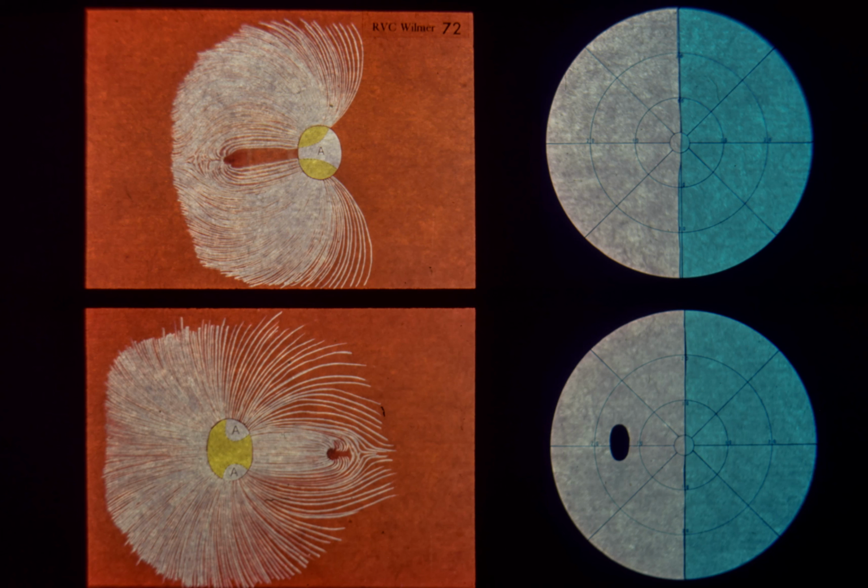Lower left. The artist's sketch shows the pattern of nerve fiber loss and optic atrophy in the left eye of a patient with a left optic tract or lateral geniculate lesion. Loss of temporal fibers results in diminution of reflexes from the superior and inferior arcuate temporal bundles and a more vertically oriented central disc pallor. Lower right, a patient with a left optic tract or geniculate lesion will have a nasal hemianopia in the left eye. The fundus ipsilateral to a tract or lateral geniculate lesion also has a distinct appearance. Loss of uncrossed temporal retinal fibers produces a nasal hemianopia.